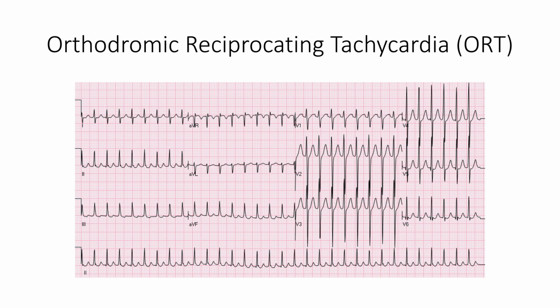Now we know that this is not antidromic AVRT because antidromic AVRT is usually only with a wide QRS, since the electrical signal enters the ventricle through the accessory pathway, and that involves slow conduction through the muscle in the ventricle, and that's a really wide, ugly QRS pattern.